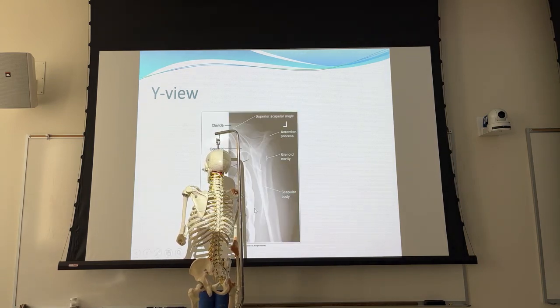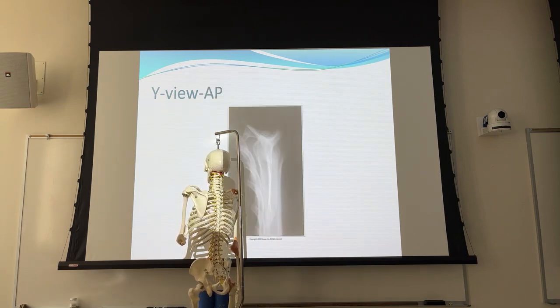Okay, so again, it's not perfect, but it's pretty good. You got your vertebral border, you got your axillary border, so they're not perfectly superimposed, but I would not repeat that. And it made it into a textbook.